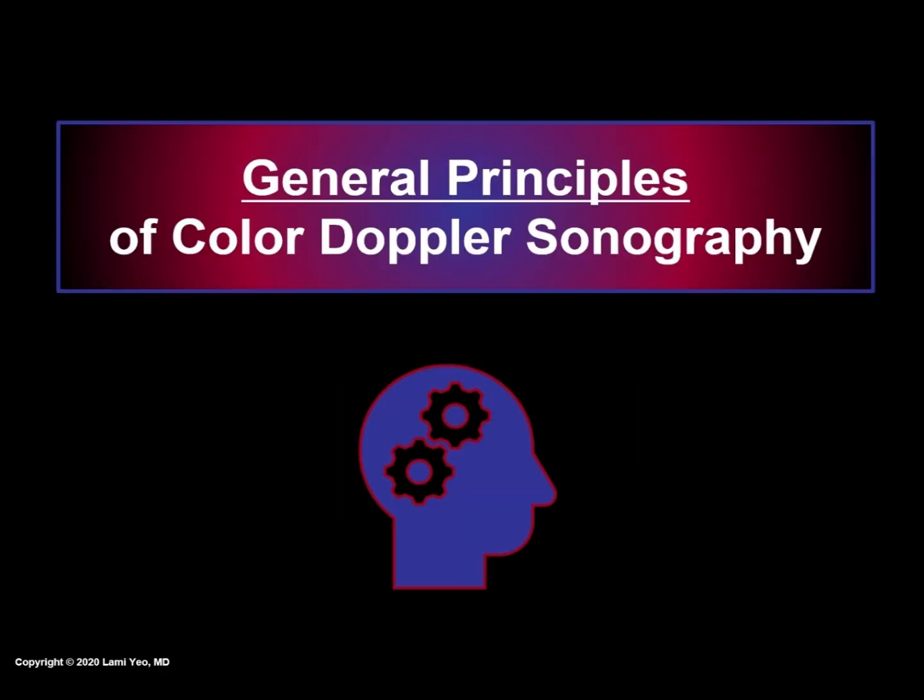This subject is important because both the quality and reproducibility of color Doppler recordings can be improved by understanding its settings and how to adjust them. For example, if the operator does not adjust setting parameters appropriately, there could be misinterpretation of blood flow information.